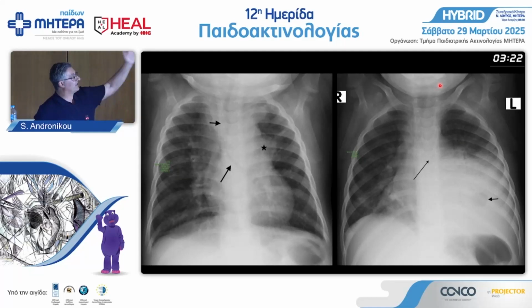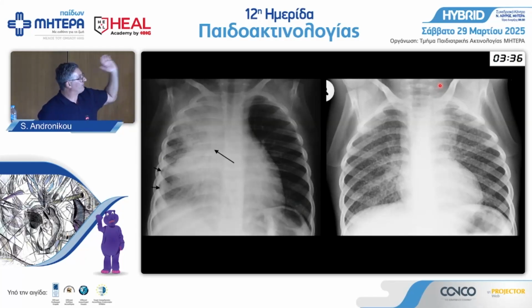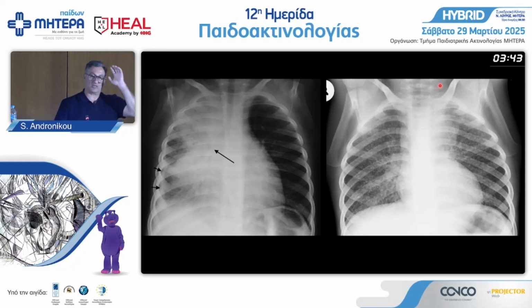So I'm pointing, the trachea is deviated. The left main bronchus is narrow, and we have lymph nodes on the left. So patient with lymphadenopathy and airway compression cannot get short course. The other patient has cavitation and airway compression. 2 reasons not to have short course. This patient has effusion, multiple lobes, and airway compression, cannot get short course. And the last one has miliary nodules, cannot get short course. All are called severe TB.